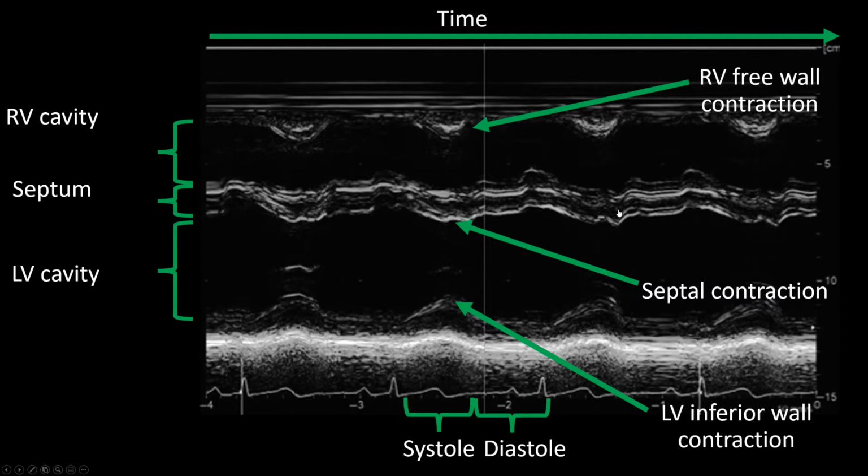Seeing all the structures is important because you need to time the relative appropriately directed movements of each of those components for M mode to be useful. This essentially allows you to deconstruct the pattern you will learn to recognize by 2D in this talk.